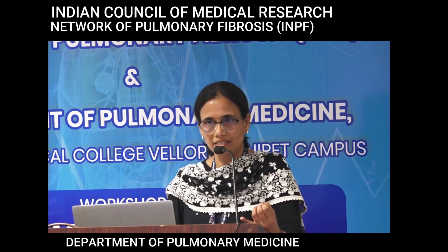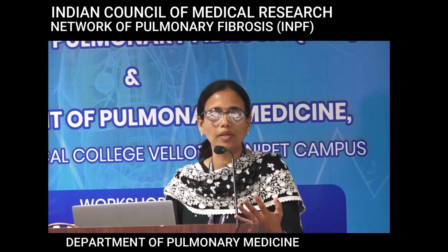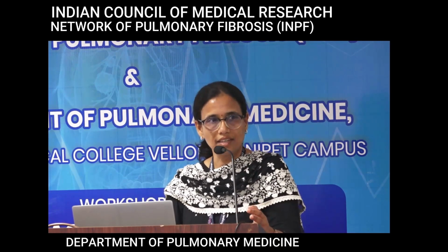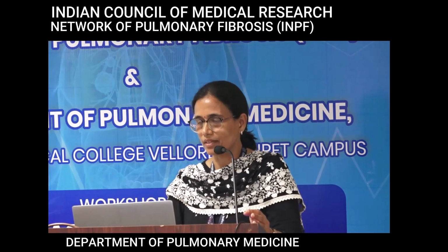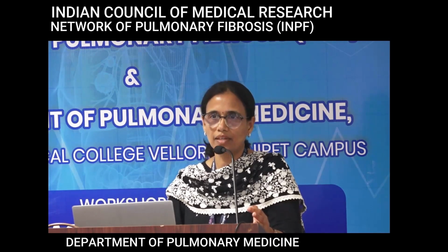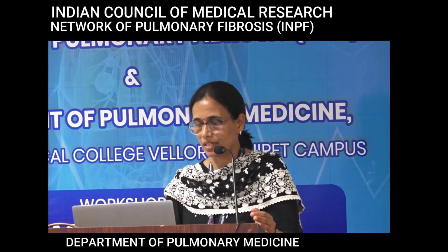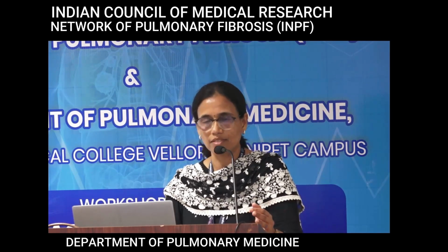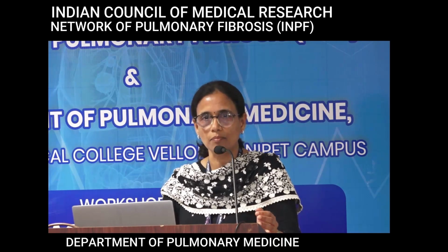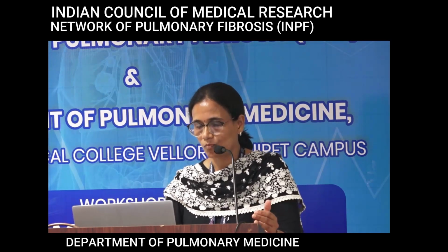It is a CTD ILD. Why are we saying that? Because we are seeing that the esophagus is dilated, likely to be an esophageal dysmotility. And what is the pattern here? It is an NSIP pattern. So what are the typical things of NSIP pattern? There's a lot of ground glass. It's more central, with immediate subpleural sparing. But immediate subpleural sparing is not seen always. It may be seen in like 40-50% of patients. So absence of subpleural sparing does not exclude NSIP, but if it is there, that helps us to say that it is likely to be NSIP.